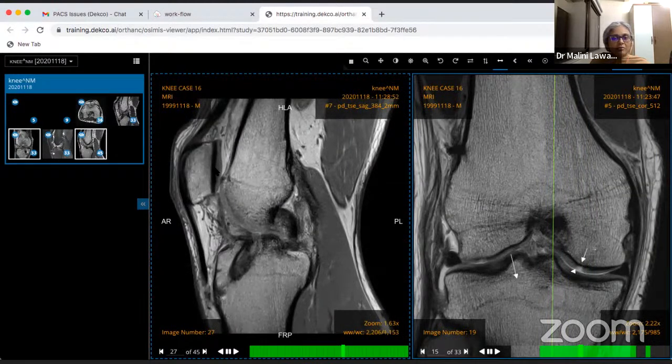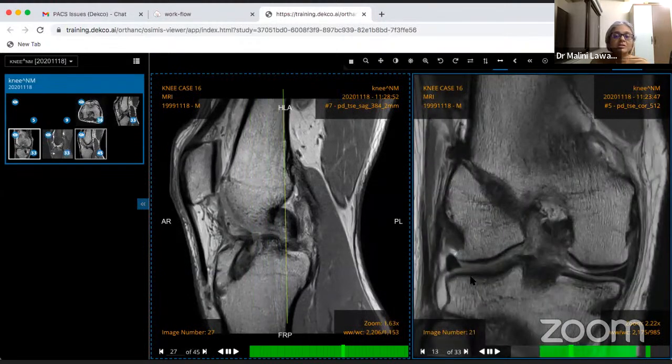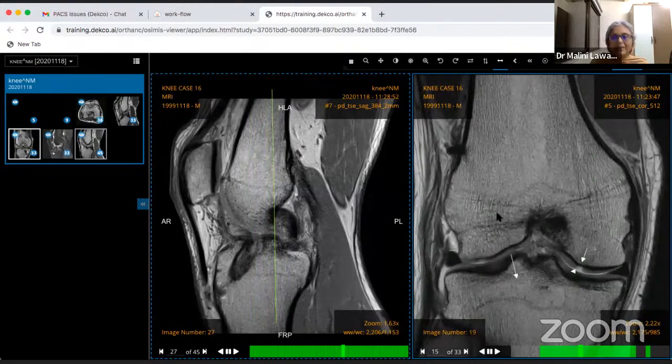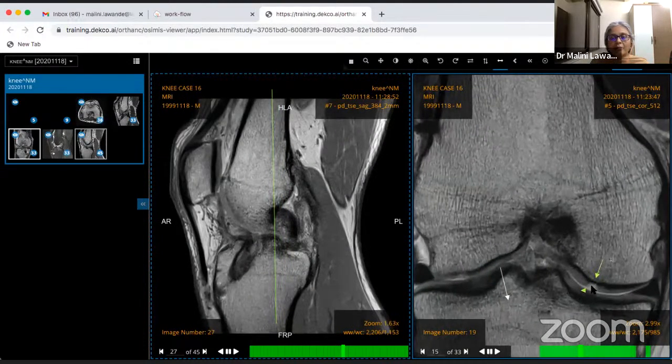Spontaneous osteonecrosis of the knee is not a term that we use now. We use subchondral insufficiency fracture, because we know that what was earlier called spontaneous osteonecrosis is the subchondral insufficiency fracture. Not all of them go into osteonecrosis with conservative management itself. We call it osteonecrosis only when there is a clear area of avascular necrosis. Otherwise, we don't use that term. And thickness wise, we mention more than 50% thickness, less than 50% thickness, or just surface fissuring. So you can use the Outerbridge classification or just give the description.